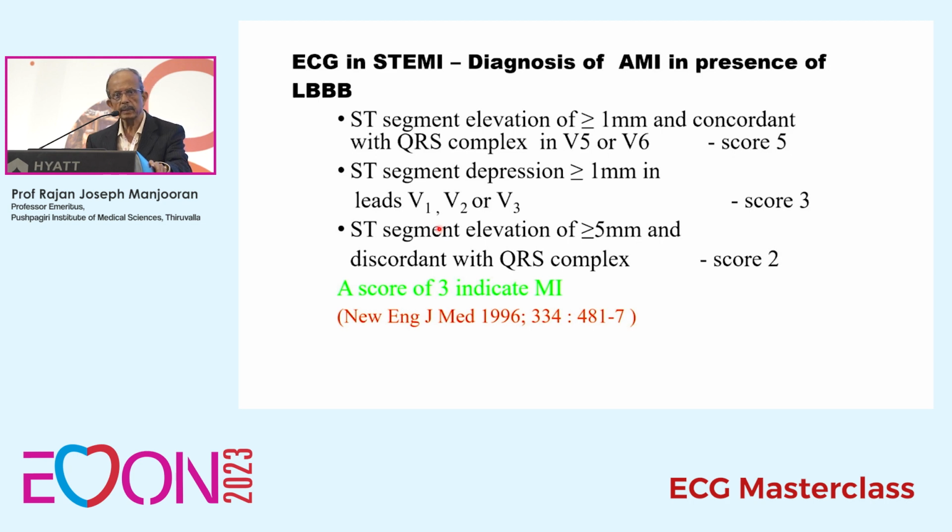Another ECG, any takers? This ECG shows, if you are careful here, you can see the alternating left bundle branch block and right bundle branch block. This is V1. This is alternating left bundle, right bundle, left bundle, right bundle. So alternating left bundle and right bundle branch block.